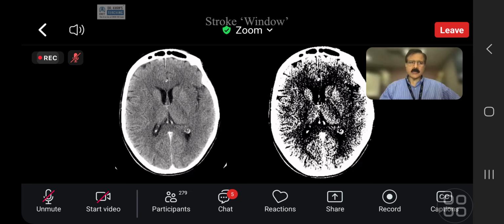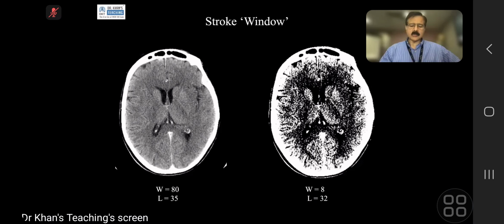Then in acute trauma cases, go for a subdural window, subdural hematoma window, or whatever you want to call it, where a subtle subdural hematoma is better seen, otherwise you will miss it because of same density like adjacent calvarium. And finally is the stroke window. So my advice is try to see it, develop your eyes on in your day-to-day practice.